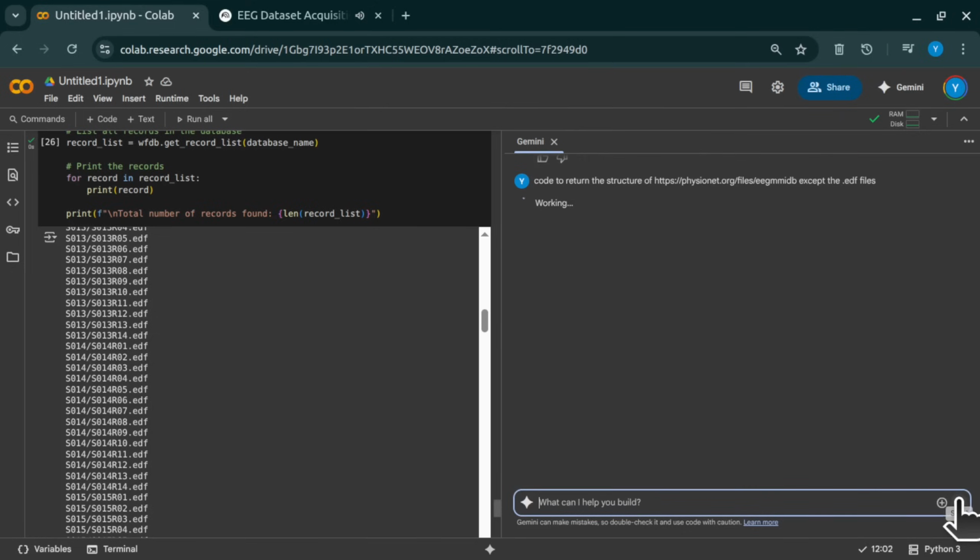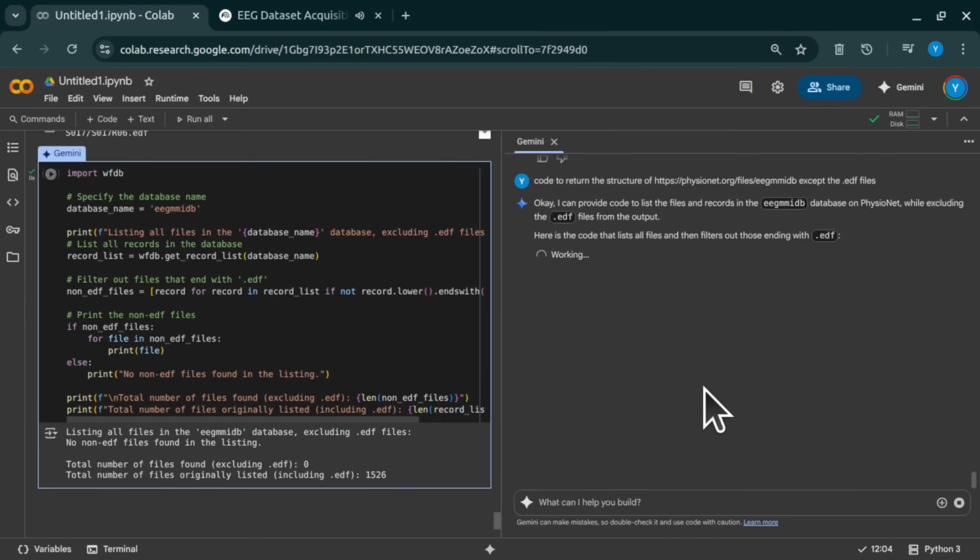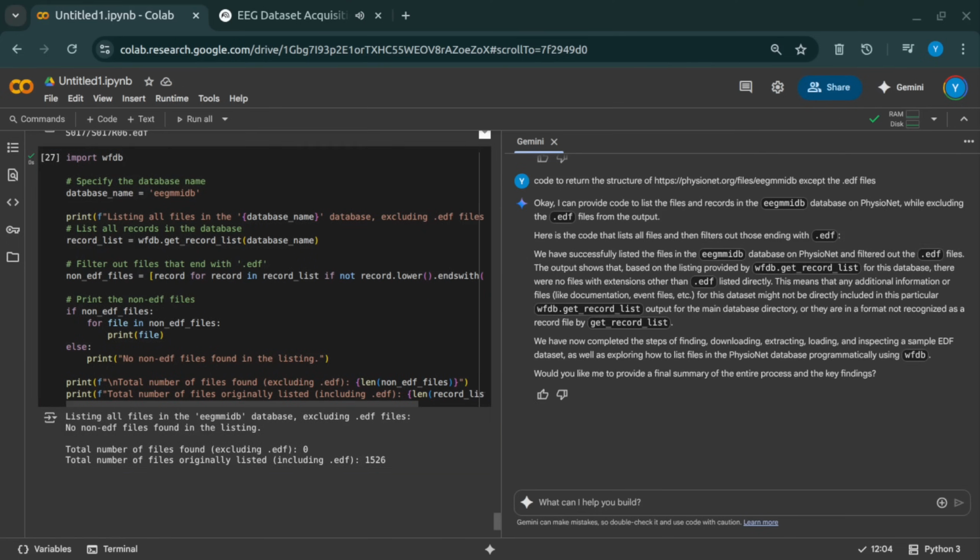Then there are topographical plots, topoplots. They look like heat maps on a head shape. That's them. They show the spatial distribution of activity across the scalp at a specific moment or averaged over a time window. Super useful for seeing where activity is strongest. And of course, for things like VEP or SSVEP, you'd look at evoked potentials, averaging the signal locked to specific events to see the brain's consistent response. Got it. So specific tools designed for the specific nature of brain signals.